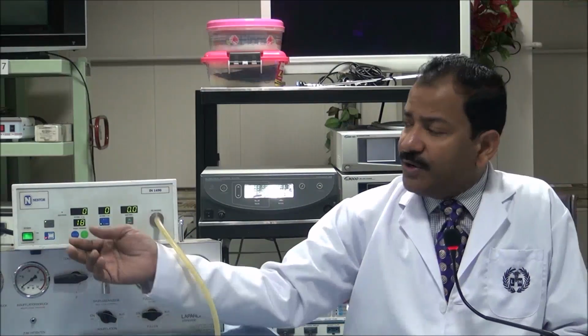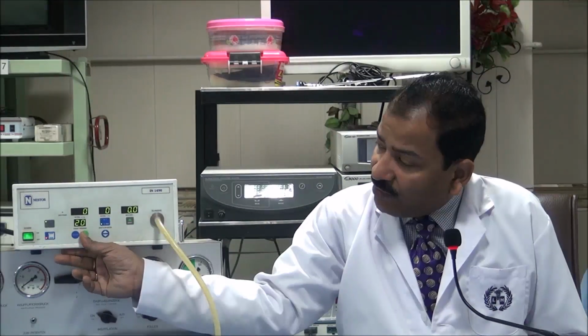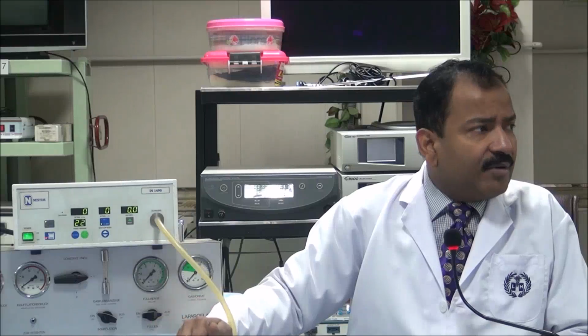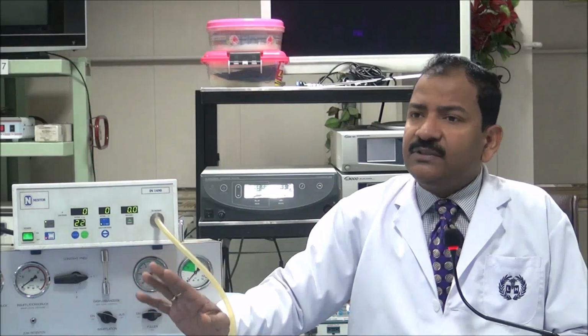Now if you are doing extraperitoneal surgery like TEP or retroperitoneoscopy, then you can go up to 22 also. Like totally extraperitoneal hernia surgery, or retroperitoneoscopic nephrolithotomy, ureterolithotomy or nephrectomy, extraperitoneal, then up to 22 it is okay. Why? Because our gas is not in the abdominal cavity, so it cannot press the vena cava and it cannot press the diaphragm.